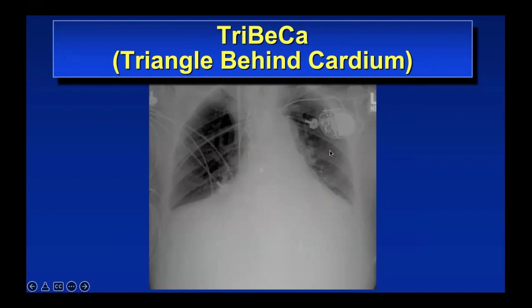And this is an area that's frequently missed by more junior people, by residents who are starting, because they don't see anything here. But remember, always look at the diaphragm. Make sure that you can see the diaphragm. Make sure you can see the descending aorta. If that triangle is filled in, then it's definitely abnormal. That is the collapse of the left lower lobe.